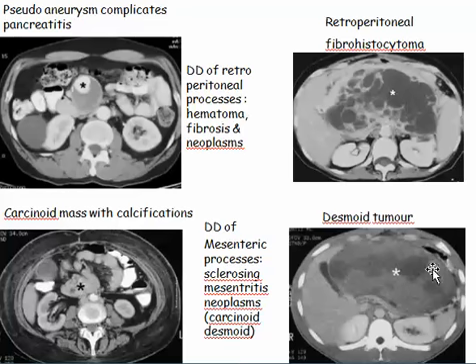This one is a large desmoid tumor, this one is a carcinoid, and this one is a fibrohistiocytoma. One of the famous tumors to be considered in abdominal masses, not only lymphoma, but fibrohistiocytoma is another possibility. So if involving the retroperitoneum, you should first differentiate whether it involves the peritoneum or retroperitoneum, as the process is sometimes confusing.